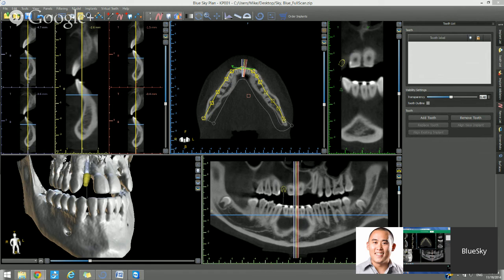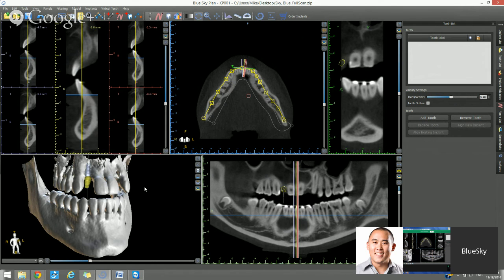Right now, you can't actually create a surgical guide based on the virtual teeth. It's something that we're discussing or thinking about. But you could place multiple virtual teeth. Everything that you see in the 3D view could be saved to an STL file and exported from the software. Okay, you need the export functionality for that, and we're not going to discuss that now. That's more of the focus of next week's webinar.